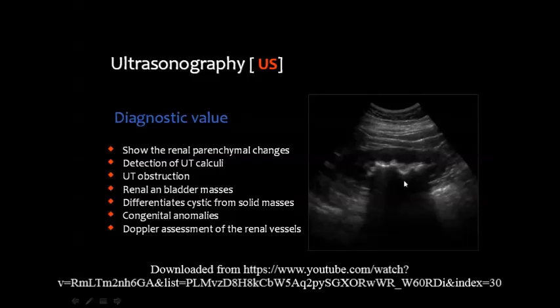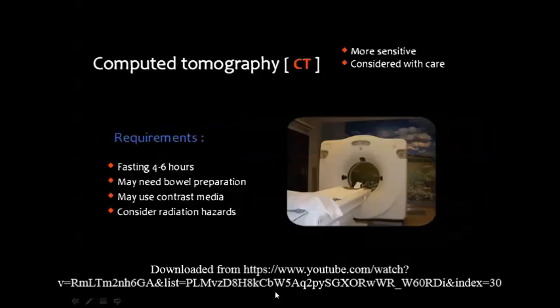Detection of renal calculi, and this is a big stone in the pelvicalyceal system with characteristic posterior acoustic shadowing. Also in detection of urinary tract obstruction, differentiation between cystic and solid masses, and assessment of congenital anomalies.